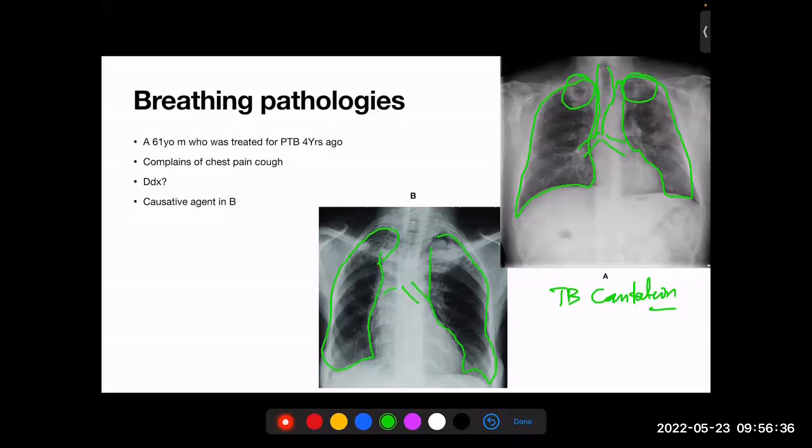There's a bit of opacification. But are you, ladies and gentlemen, seeing this? What is that? Aspergilloma. Yeah, that's aspergilloma. How can you tell it's aspergilloma, not TB, or say a metastasis? Look at the cavity around it. You see, this is the mass, but then there is that black space around it.